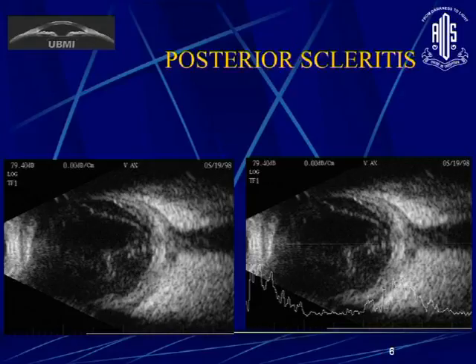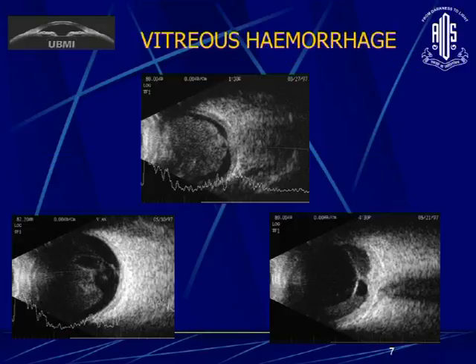Now, what type of infection is there is difficult to say from ultrasound, but this is a classic exam case where there is fluid in the Tenon space. There is enlargement of the optic nerve, more thickening of the chorioretinal layer at the posterior pole, less at the periphery. This is classical posterior scleritis. If you are exam going, this will come in the exams for sure.